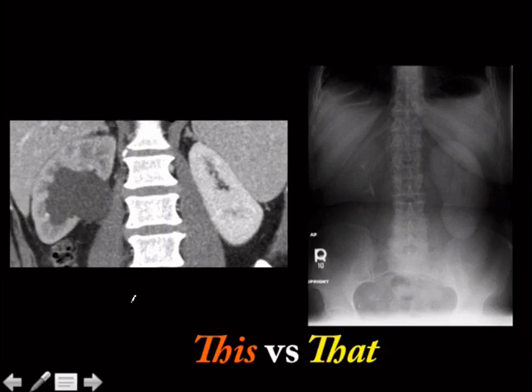That's what you're seeing. The urine trying to get out against an obstruction, either a cancer, fibrosis, a stone, is causing back pressure, and that back pressure is causing delayed blood flow, which is the reason you have this appearance. That by itself defines obstructive uropathy. Hydro does not mean you're obstructed.